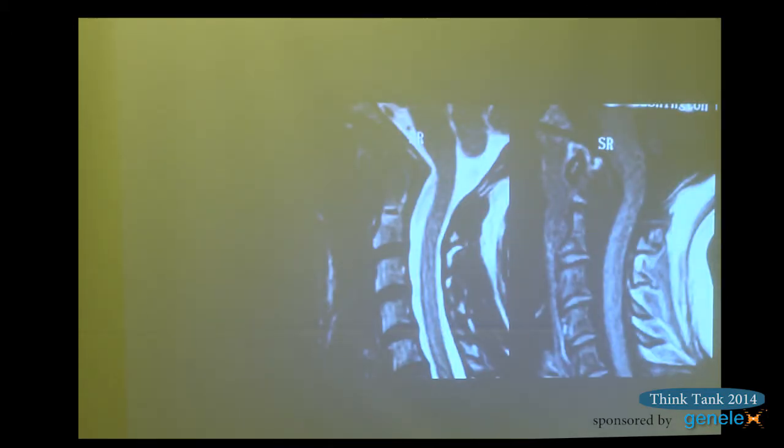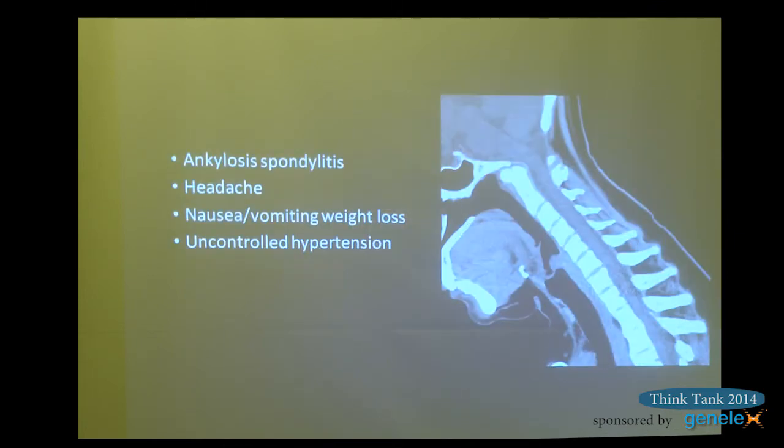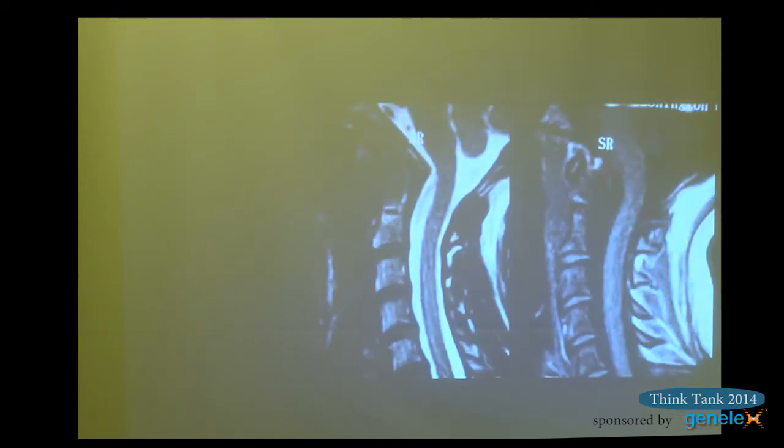This is an MRI, and it doesn't look nearly as scary on the MRI as it did on the CT at that level. One of the issues with MRI is there's more room for artifacts. That doesn't project it. There's definitely more impingement than this shows. This is the spinal fluid. This is the cord.